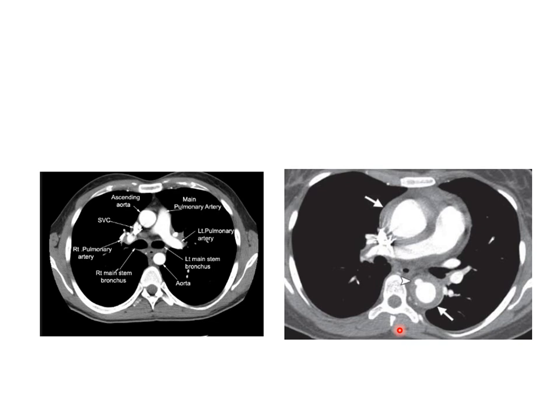Conventional angio does not give us information about the wall of the aorta, unlike CT and MR. And of course CT angio has less radiation than the conventional angio. Any abnormality in the wall like calcification, mural thrombosis, gas, we can detect it in CT angio, not detected by conventional angio.